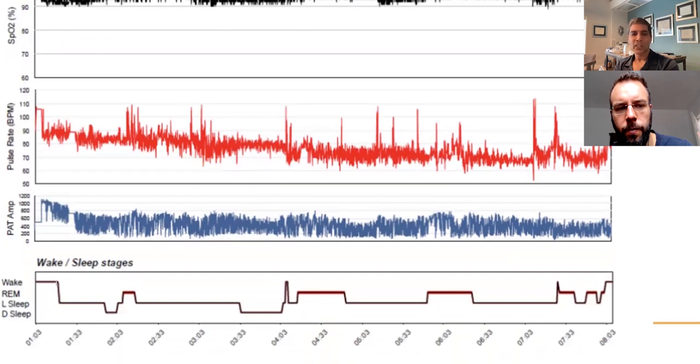The hypnogram is useful, though, and usually there's light sleep, deep sleep, REM. That's one cycle. Light sleep, deep sleep, REM. That's another cycle. Light sleep, and there's no deep sleep in this case, but REM, the third cycle, and then a fourth cycle. Normally, there's 4 to 6 cycles during the night. And in this particular case, there's 4 cycles.